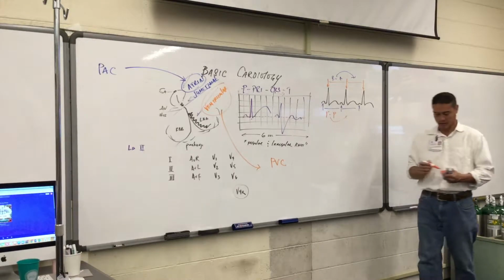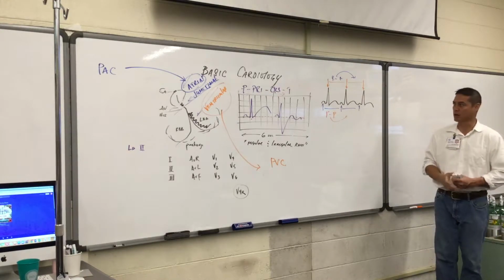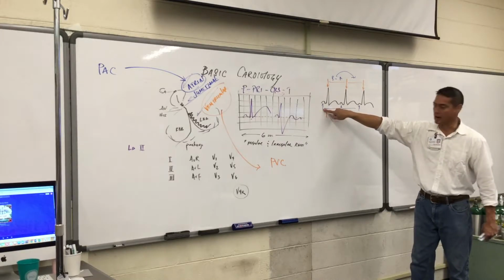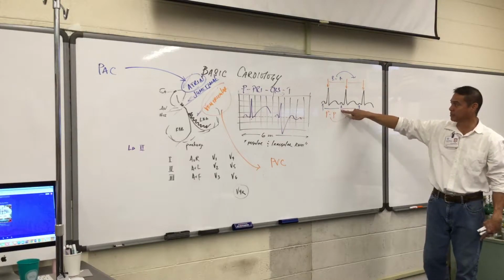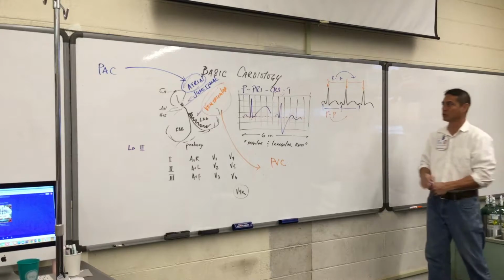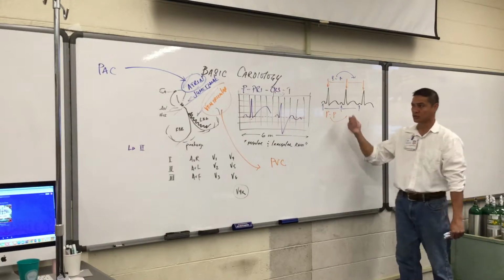Now, because we're trying to figure out, well, what are we measuring it to? We're just using some type of marker that shows that when I put a piece of paper down and I put a dot here and a dot here, when I move that dots over, it'll line exactly back up to where we have the next P. You don't need to have a specific type of ruler to measure. So any blank piece of paper you can use as you look at an EKG strip.